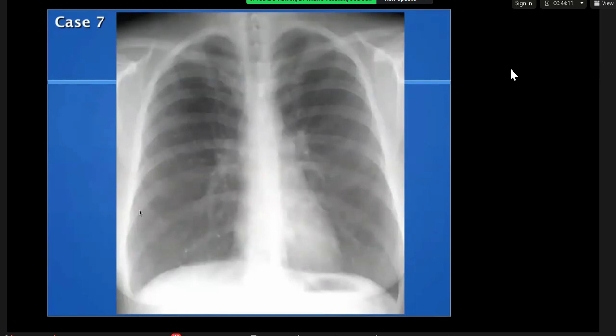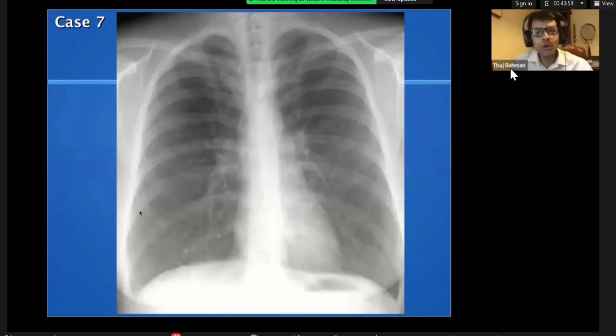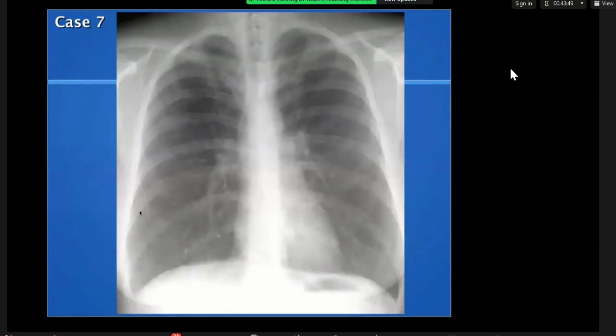So again, it's a frontal radiograph, normal heart size and mediastinal contours, trachea central, both diaphragms are distinct, and I can see bilateral nodules. They look nodular. Are they nodules or are they reticulations? At one point, they look like cystic lungs. I think there are multiple cystic areas scattered throughout both lungs.